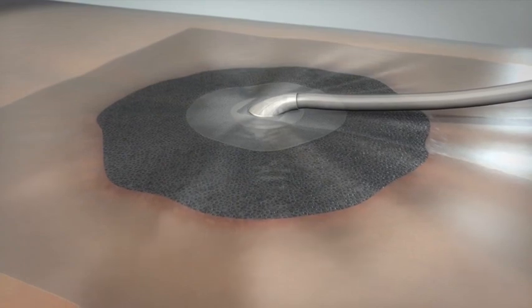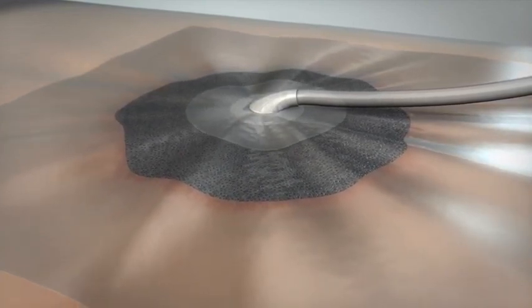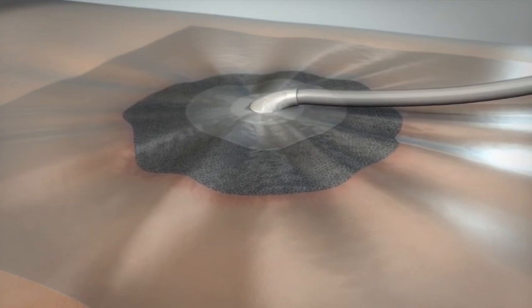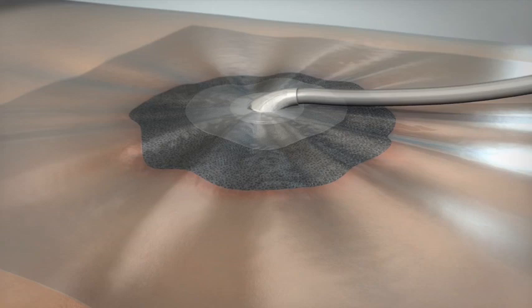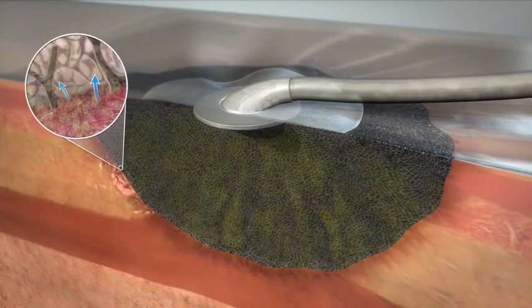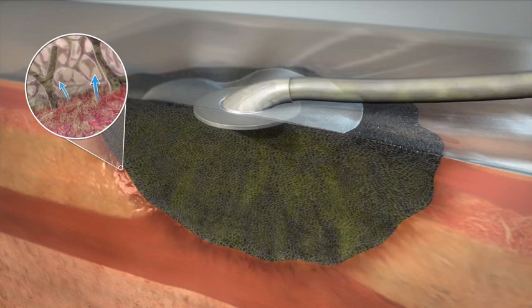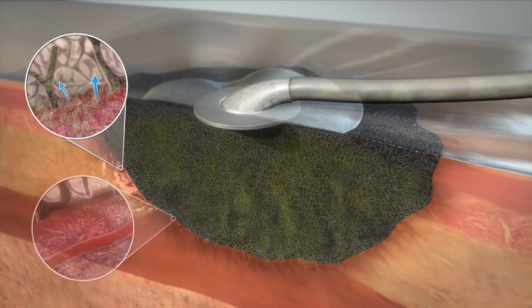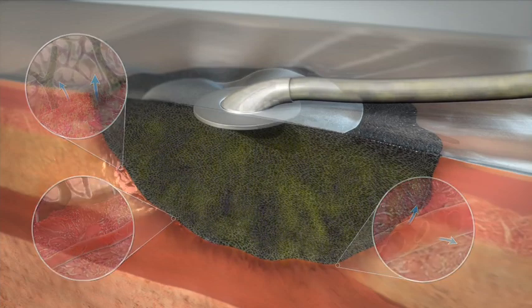Macrostrain is the physical response that can be seen immediately as the wound edges are drawn together, thereby ensuring that there is optimal contact between the wound bed and the granufoam dressing. Macrostrain facilitates removal of wound exudate, which may contain inhibitors of wound healing. Removal of wound fluids assists in the reduction of edema, which facilitates the flow of blood into the wound bed, providing the oxygen and nutrients that are needed for wound healing.